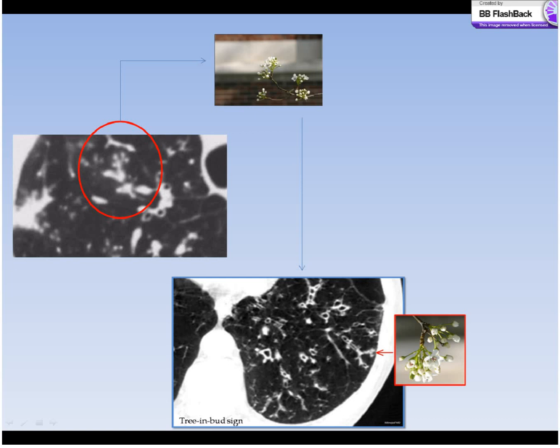And here's a better representation in this lower CT chest cut. So you're following this inflamed airway, which we'll get to in a couple slides, all the way out, and you see this white thickened stalk with little buds on a tree. Well, that white thickened stalk is a terminal bronchiole that traverses a secondary lobule, and the little dots are mucus-filled alveoli. So the septa would be something like this, the terminal bronchiole into little alveoli, and that's what you're seeing.